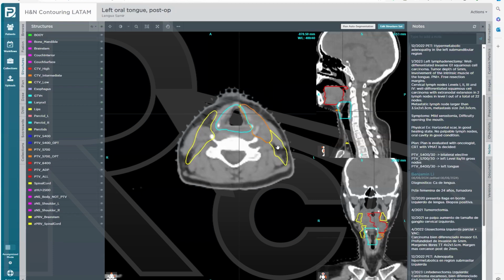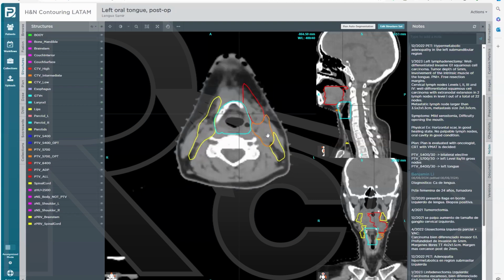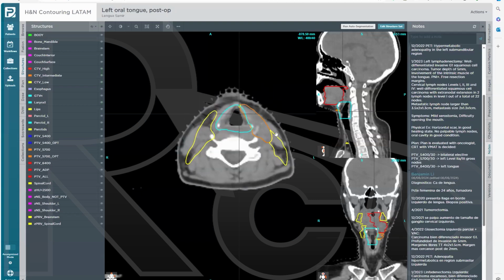Excellent question. At minimum, when the neck is dissected, I cover the medial half of the sternocleidomastoid muscle. So I do cover at least part of the sternocleidomastoid muscle that's been surgically dissected. This is kind of my own little pearl: I cover the medial half, just like here. But if I'm worried about invasion of the sternocleidomastoid muscle, the extranodal extension, I cover the whole muscle. But it's not wrong to always cover the whole muscle if you want to.